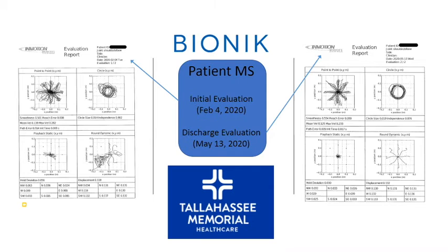And then in the circle pattern, you notice that it's kind of an elliptical shape on the left, but it's still pretty large. So he hasn't lost range, but he's actually lost the coordination to make a circle. If you look at the bottom, this is where it's the most dramatic. If you look at the strength plot, which is the one to the bottom right, you can actually see that he goes from a scribbly motion to a perfect star, which means this guy got a lot better. And that just means that Sue has a lot more to work with.